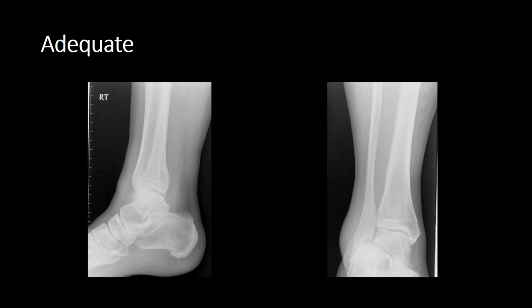It's important to take good quality radiographs, as inadequate imaging can mean that subtle injuries can be overlooked. Let's have a look at this ankle x-ray. The lateral view is under-rotated, and we know that because we can see both the anterior and posterior cortices of the talar dome. A good quality lateral ankle view will have a lateral ankle joint. Some people think that you need to get the fibula projected behind the tibia for a good quality lateral ankle, but that's not so. It's the ankle joint that we specifically want to be lateral.